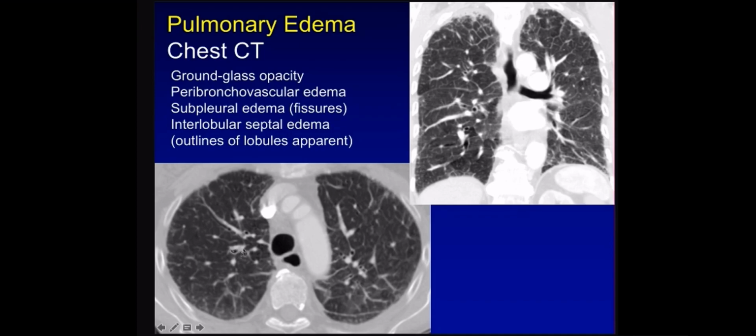Notice the bronchovascular pairs here, the airway and artery have very blurred, sort of edematous-looking margins. And notice the fissure, it looks more prominent than usual, thickened by this subpleural interstitium. Again, 2 layers of subpleural interstitium. You could even look along the periphery of the lung and notice that here the subpleural interstitium gives you just a very slight blurry interface as well. And then the classic finding of the interlobular septal thickening. On the chest radiograph, we're going to call those Kerley B lines.